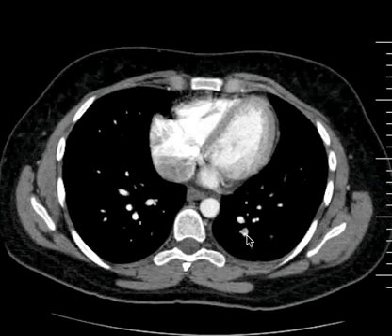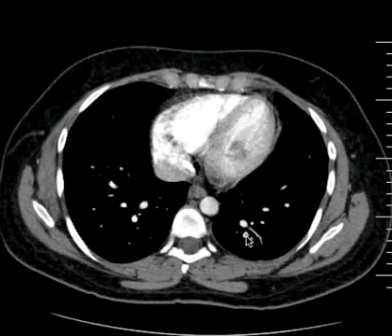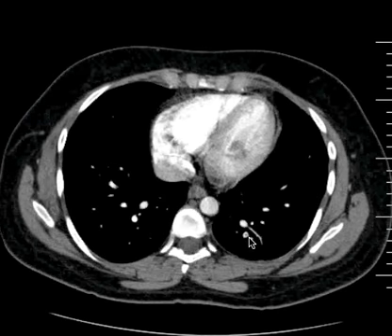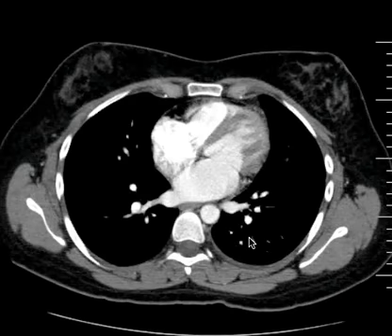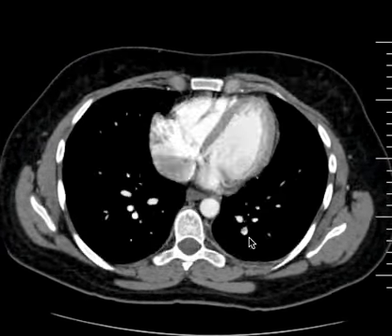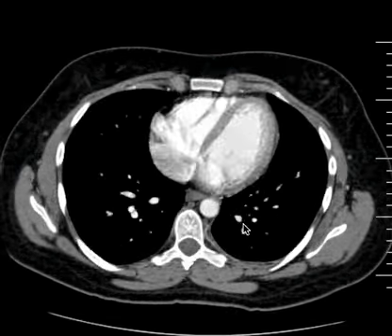And this is the little bit harder level where you have the smaller branches involved, but look how nicely you can see the tubular character. Of course, that would be more clear on a coronal image, where you'd catch the length of that pulmonary arterial filling defect. Okay, I'm going to go back down to this to illustrate another point. Here you see a pulmonary artery with a clot. This is a pulmonary vein. Watch this vessel as we go back up.